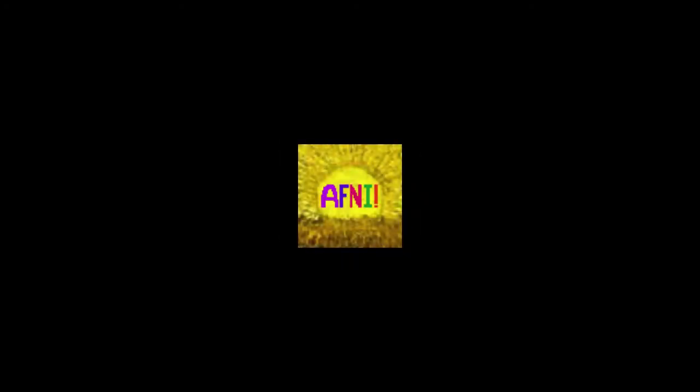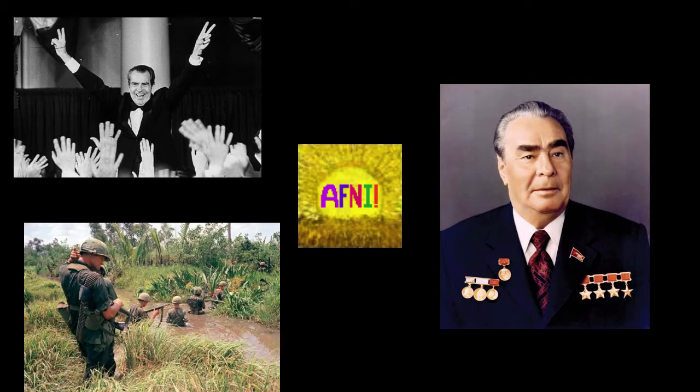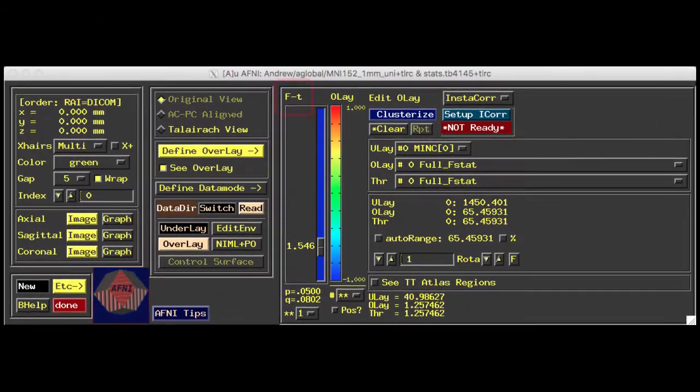AFNI is a program that we call old school, meaning that if you were born after 1970, you may find some of the features difficult to understand, especially in the viewer. However, there are some useful features hidden in the viewer that will make visualizing your data easier.